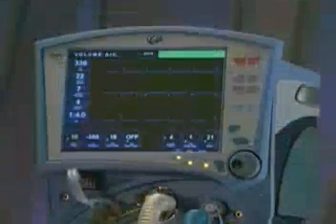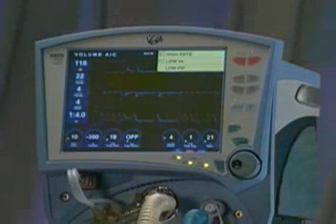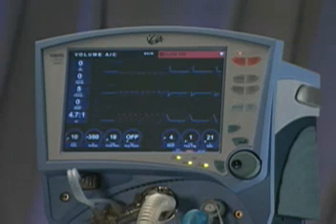The alarm indicator in the upper right corner of the touchscreen displays up to 9 messages. The indicator is green when no alarm condition exists. High priority alarms are audible alarms and display a red bar and flashing icon.